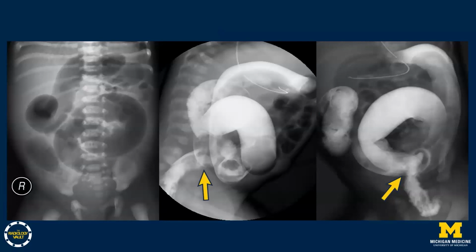Another patient with too many loops to count. We see dilated loops on the abdominal radiograph, but also a few air-filled loops interspersed, so too many to count. If you look at the middle image, we can see dilated small bowel as well. And those are the air-filled loops of bowel that are anteriorly located. The arrows are pointing to the transition zone with the associated abnormal rectosigmoid ratio. Again, there is some spasm of the rectum, the aganglionic segment.